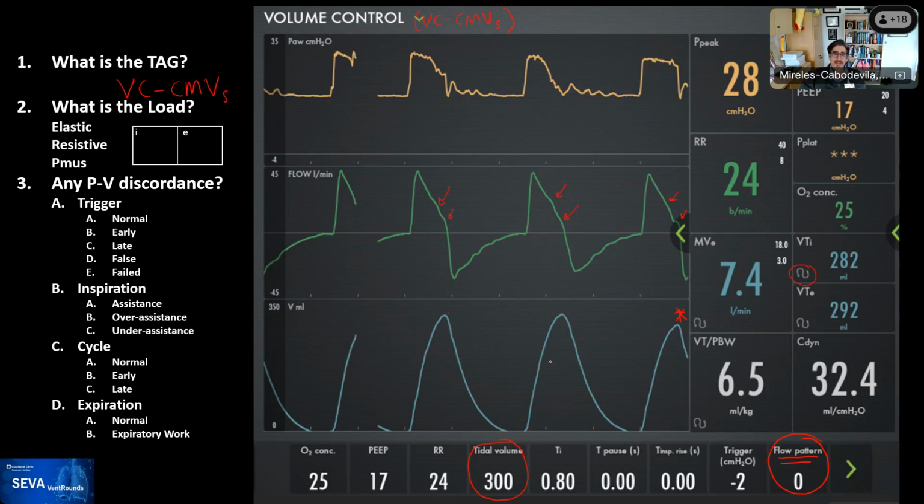Rob? Yeah, the ventilator will shut off after it delivers, let's say 300 mLs, corrected for BTPS. But the patient can always get a little bit more flow and volume by sucking the gas that's stored in the compressible volume of the patient circuit, right? So adult patient circuits have a compliance of something like 2, 3, or 4 mLs per centimeter water pressure. And if the PMUS is 10, something big, then you multiply 10 by 3 and you get 30 mLs you can suck out of the circuit. And that's about what we're seeing here, right? That's correct.